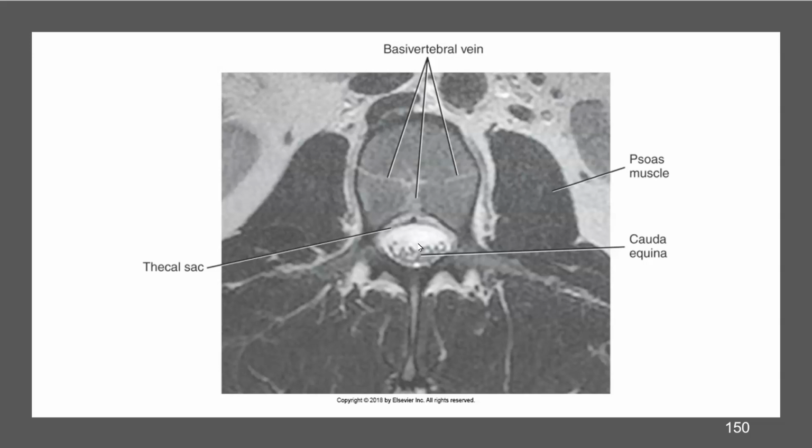We covered the spine pretty quick. There's 150 slides, so I'm sorry if I went really fast. We did it in under 45 minutes, so that was the goal. A lot of it is anatomy review, but looking at it within CT and MRI is a little bit different. So make sure you study and you know your anatomy and try to visualize it in the sagittal, coronal, and axial planes. Good job.